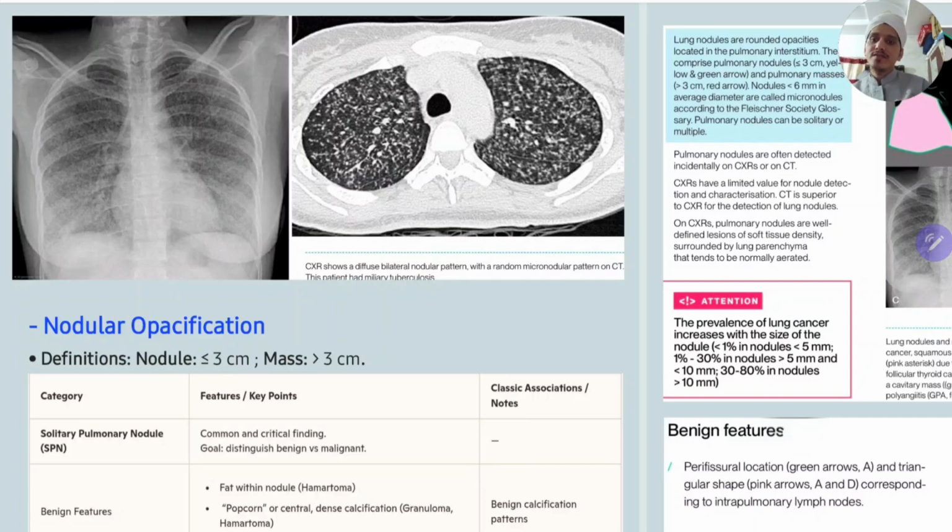You may get patients whose chest X-ray looks like interstitial opacification, but the patient doesn't have any breathlessness, any past COVID, nothing. No symptoms will be there. So you can't make out any diagnosis from that. Okay, so that was interstitial opacification.